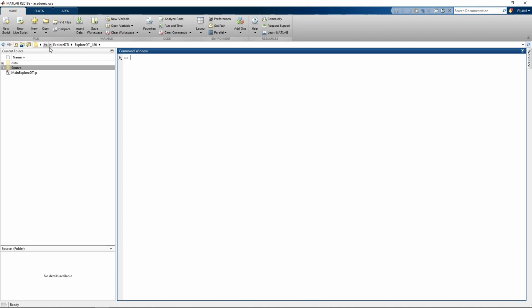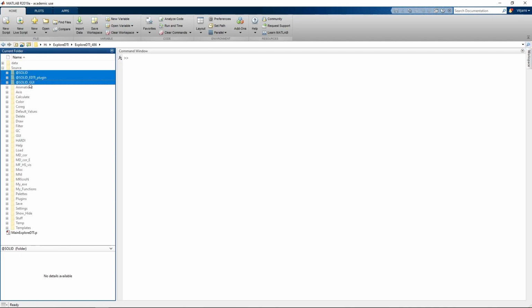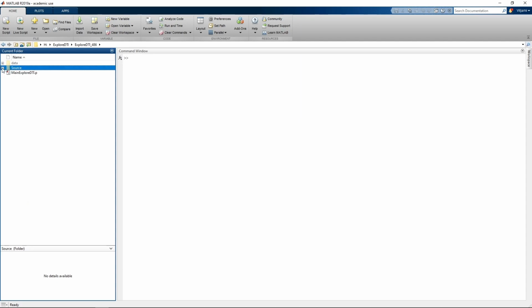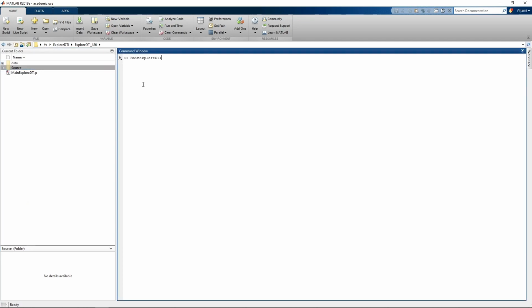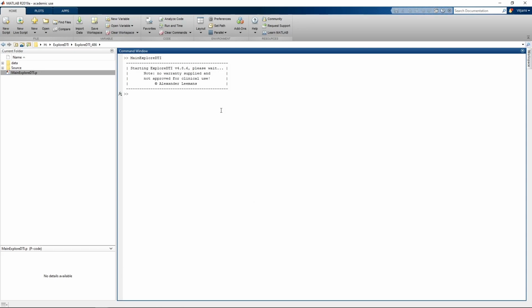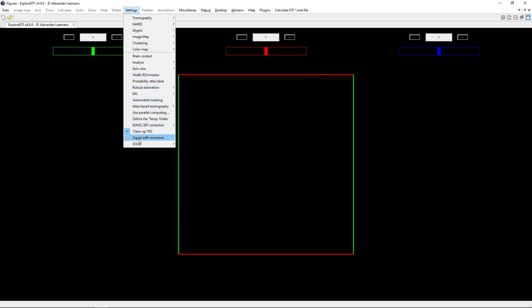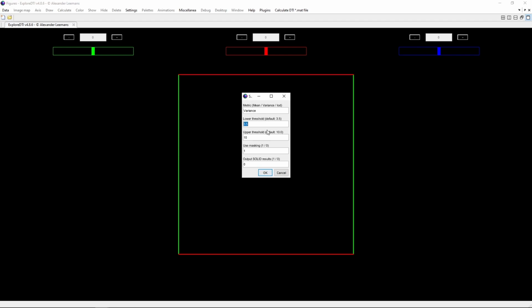After downloading Solid classes, you need to add them to your MATLAB path or extract them to ExploreDTI source directory. In MATLAB, first launch ExploreDTI, then type solid_edti_plugin on the MATLAB command line to enable Solid. Settings for Solid are added to the end of ExploreDTI settings menu. Use the settings to add thresholds or outlier detection method.